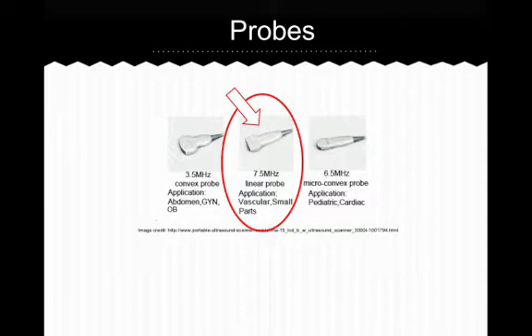The phased array probe, also known as the cardiac probe, emits waves from a focal source in an arc that will produce a wedge-shaped image. It has a small footprint and thus is good in echocardiography because it can sneak views in between the ribs.